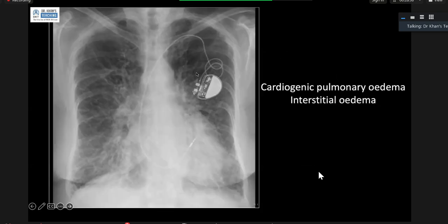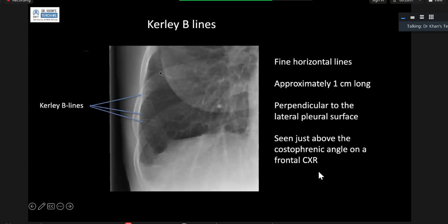Now, the next one. Now we are looking at cardiomegaly, and you can see more than what you see with just the lung blood vessels. More than that is there right at the periphery. So this is interstitial thickening. This is interstitial fluid retention within the septae, interlobular septae. So this is interstitial edema. This is how interstitial edema looks. There is no alveolar edema component here, right? So this is an interstitial pattern, and that's what we learned earlier.